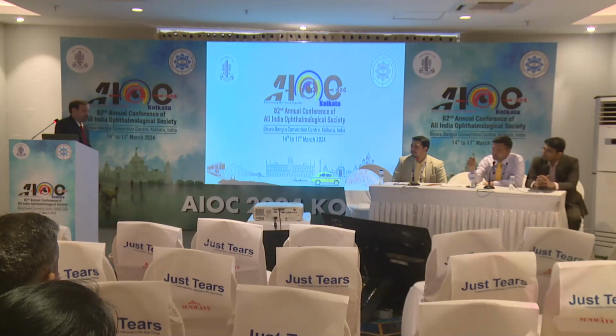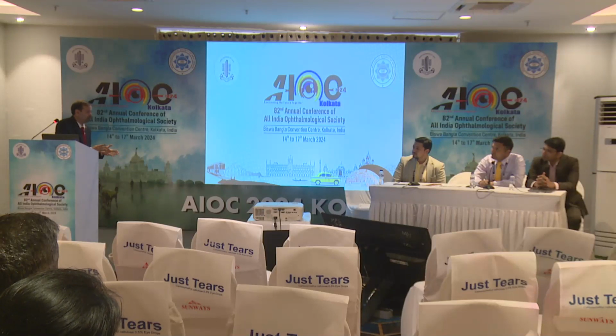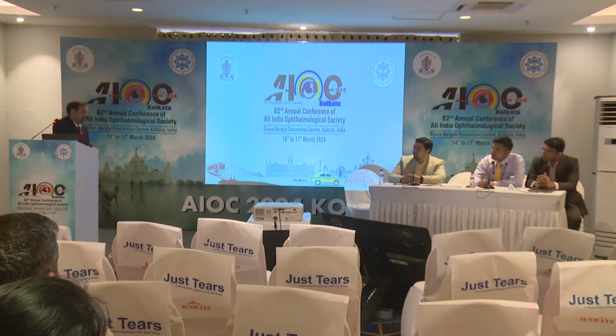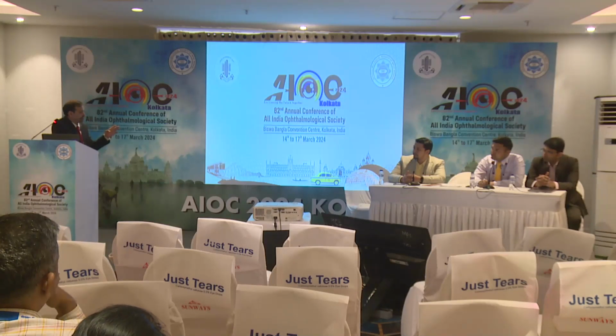Okay, that's a very good question. I have repeated several times that we do see some changes even in normal looking eyes. So even if there are milder grades of diabetic retinopathy, we know that at least in today's scenario, we do not have any treatment. So even if you detect certain changes on OCTA, we do not do anything. But it does show some insight as to what is happening in the pathogenesis of diabetic retinopathy. We always knew that diabetic retinopathy is a vascular disease, but now we have evidence which shows that a neurological component is going on simultaneously.